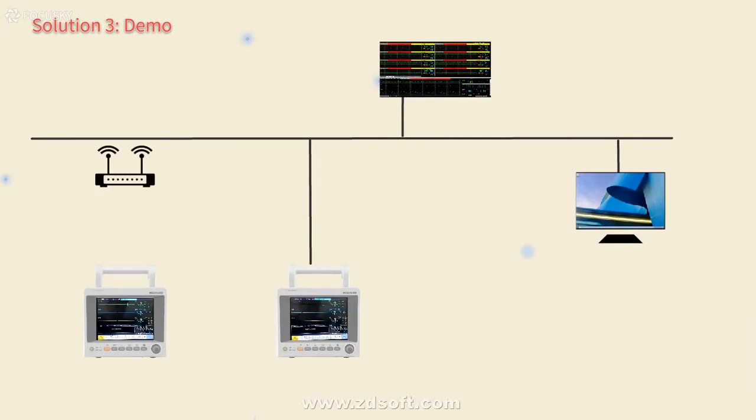Our patient monitors have the ability to connect via wireless or hardwired cable. In this demonstration, we have configured our wireless patient monitor to 192.168.27.127.